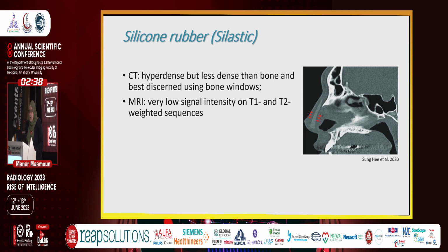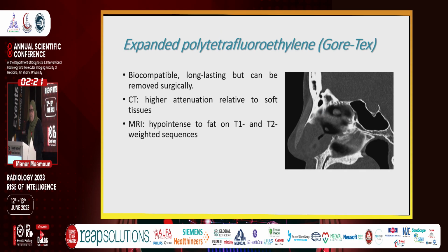The radiologic finding of peri-implant radiolucent halo relates to the capsule formed around the silicone implant. This finding helped the surgeon to identify an unknown implant before a re-implantation, before a second procedure. Example of Gore-Tex implant showing internal hypoattenuation compared to the silicone implant.